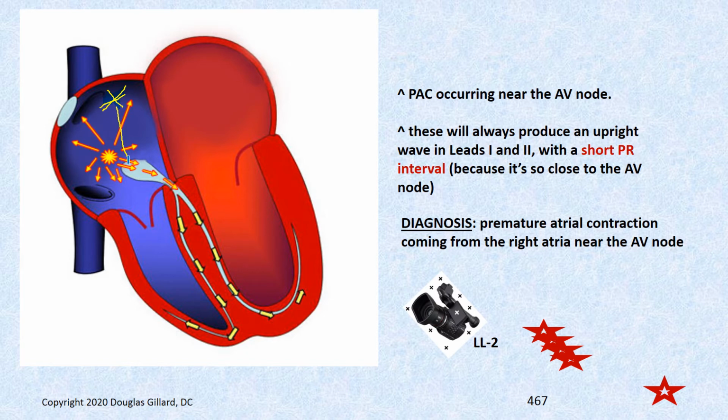So it is a PR segment, or PR interval, because the P wave is going to be bigger and it's going to take more time because it's not using the normal pathways to spread its depolarization through the atria. And some of it's going to go over this way. So instead of a little short P wave, you're going to have a P wave that is bigger voltage. And the PR interval in general will be longer because it takes more time to get across here. Okay, so I was okay on that.